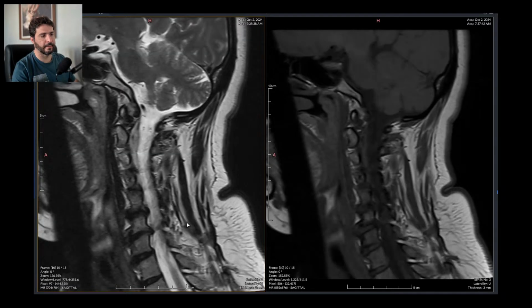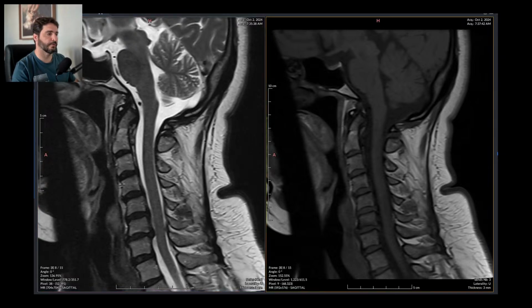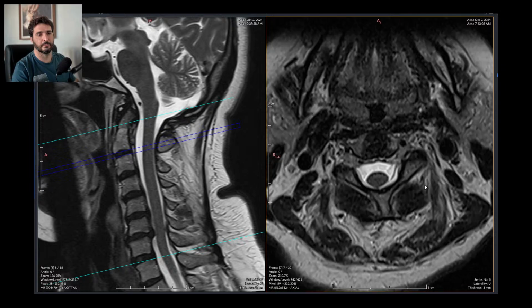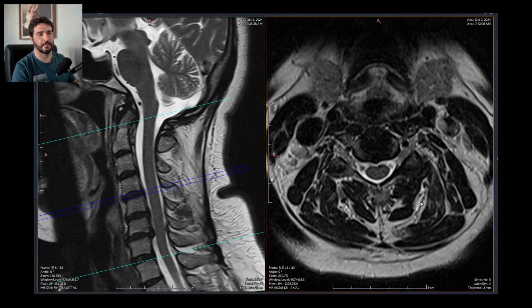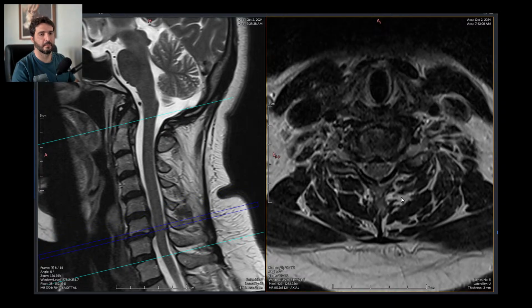Moderate arthrosis right there, and moderate arthrosis right there. Let's see if I have also stenosis of the neural foramina. Nothing much. Neural foramina is right here, and nothing much. The nerve roots are fine. Let's go. Fine. And there is stenosis right there. The nerve roots are compressed against the hypertrophic facet and uncovertebral joints right there.